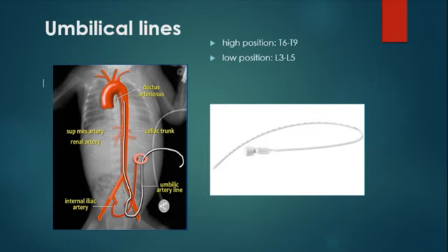So for the neonates, the umbilical cord consists anatomically of 2 arteries and 1 vein. The catheter will be inserted through the umbilicus into the artery. Whether it is entered into the left or the right side doesn't matter. The important thing is the direction of the catheter. It will be flipped down, enter from the umbilical artery into the internal iliac, and then to the common iliac, and then go up into the aorta. Sometimes it goes from the other side.